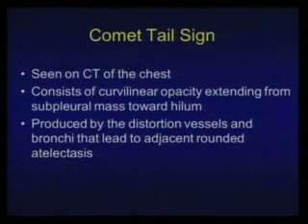When we have rounded atelectasis, there is always an associated chronic pleural disease. So that is a sine qua non condition. You have to see a chronic pleural disease with pleural effusion or not, with pleural plaques or not, with calcification, with thickening of the layers, but you have to see that.